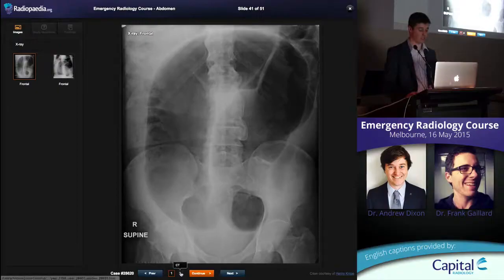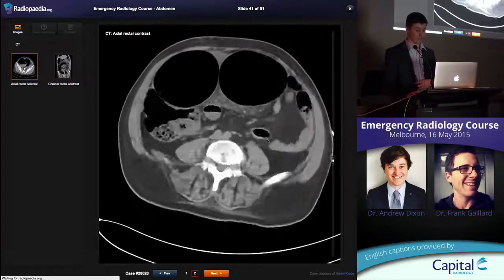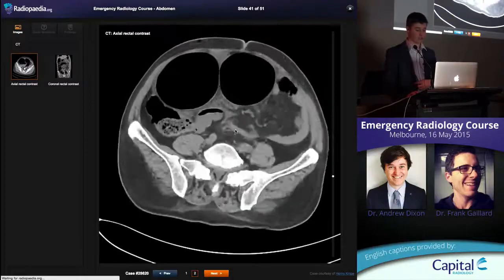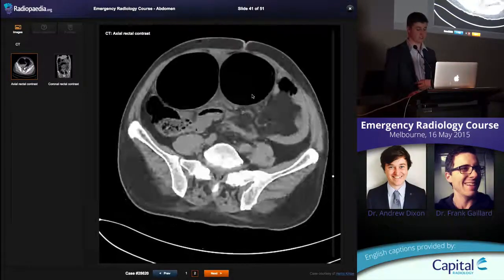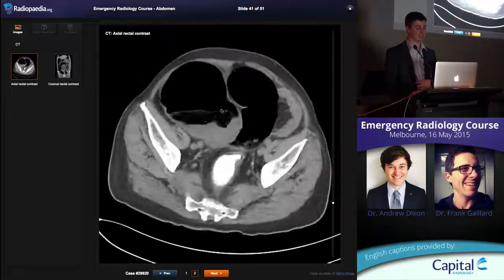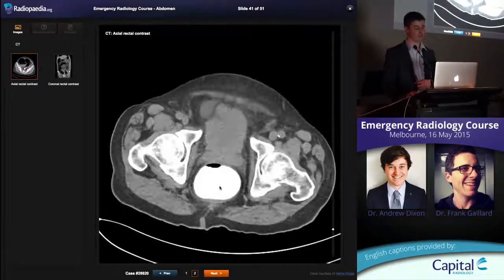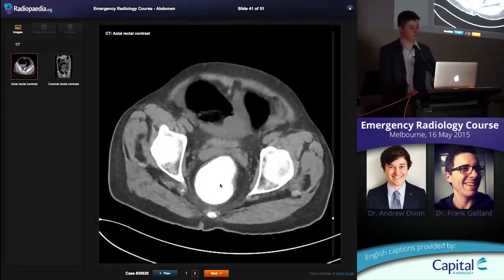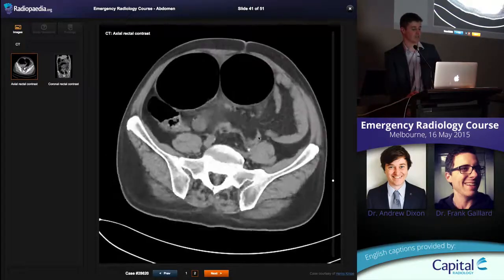Okay. On the CT, you can follow your descending colon down, and you'll find that it goes into the suddenly distended sigmoid colon. Follow that right up, and it's going to come down to exactly the same spot and collapse down to nothing. This patient's had rectal contrast put in, which can be useful in determining whether there's a complete obstruction or not. See how it tapers down and then goes into that same spot as well.